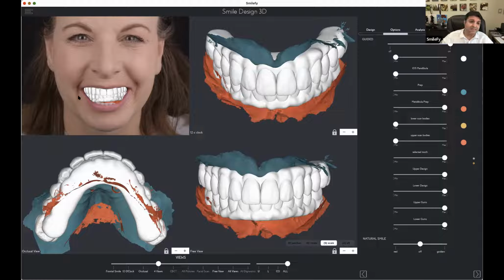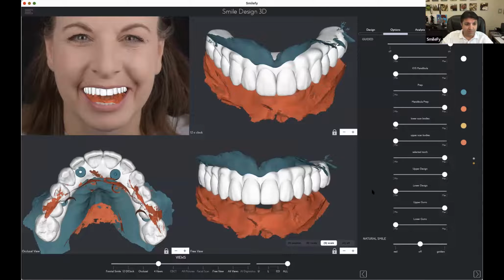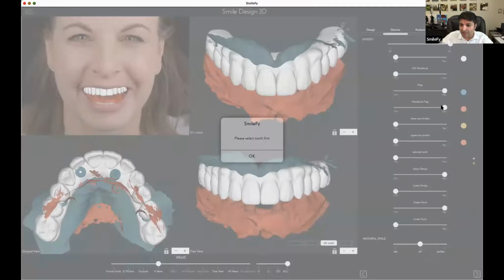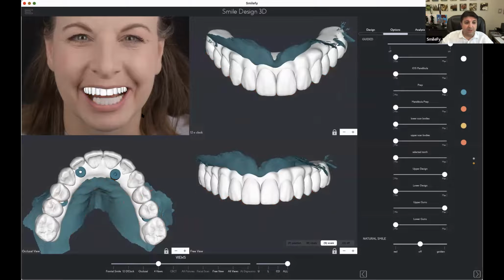I just realized that when we talk about the design and everything, we do have actually different perspectives on a smile, and with the picture we need to consider, of course, the position of the picture. Let me reduce this one, because I want to show you something else.